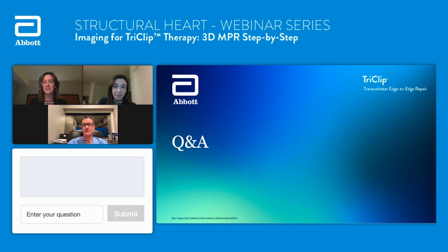If you've got a good 2D image, whether it's an inflow, outflow, or even a bicaval view where you see just a little bit of the tricuspid valve, do your MPR then and understand how to manipulate, how to spin, how to use the Z rotate, how to manipulate the planes. It's literally a 10-minute learning curve. But it's well worth the investment. But you have to practice on either normals or people where you're not in the throes of an intense procedure.